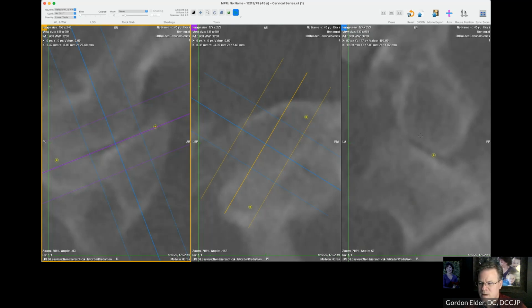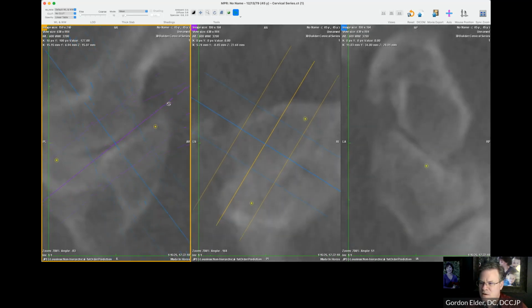So we call that a bilateral misalignment. So it's off to the left. If this is out here to the left further than the skull, it's still off to the left, but it's a little bit different. It's an overlap, but it's not clear. It's not clear.